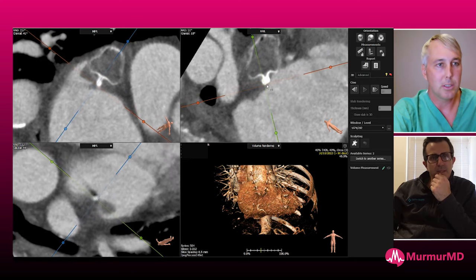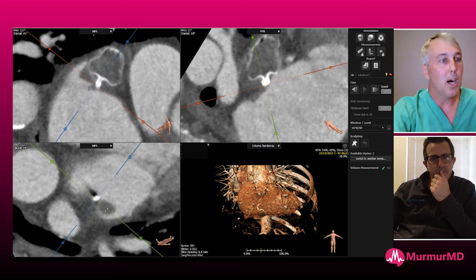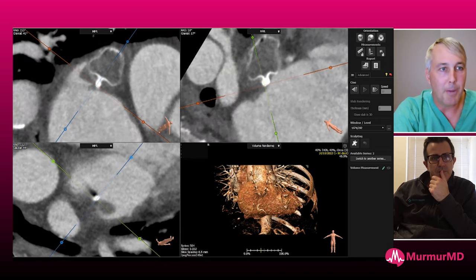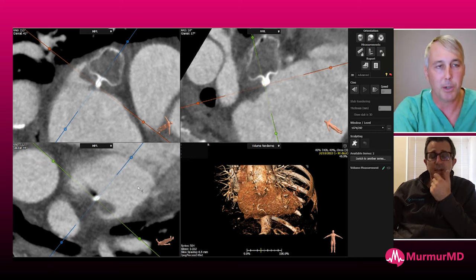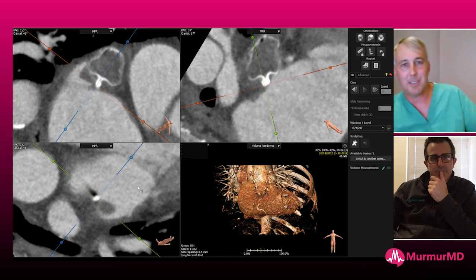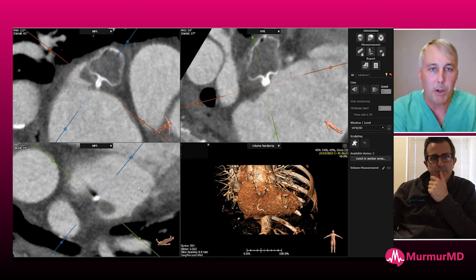And are you looking at this with the aortic package of 3mensio? So 3mensio does have a left atrial appendage package. Yeah. I found that I can do most of what we need to do just in the 3D portion in the aortic, so that's what I'm using here. That's what I've used too, because we have the mitral. I trialed the left atrial appendage package, but it didn't offer me all that much more. The TruePlan software from Boston, I think, is pretty neat stuff. But anyway, this is what we use right now.